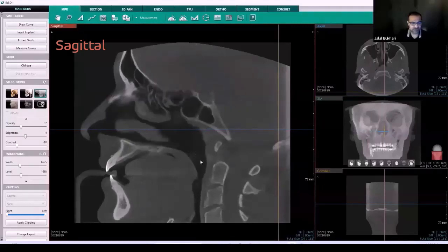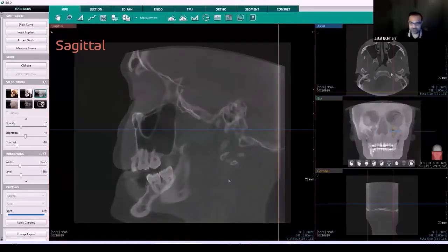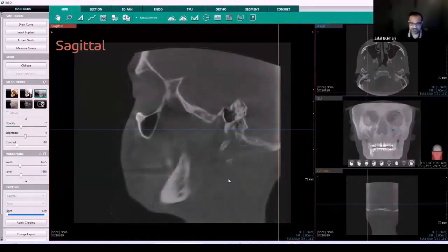It gives you a good cross-section right behind the tongue and the soft palate to evaluate certain dimensions. Now, for those who are interested in obstructive sleep apnea diagnosis and intervention, this is a great view to evaluate the anteroposterior dimensions of the airway. I'm going to go back towards the right side and take my same approach on evaluating the soft tissue regions.